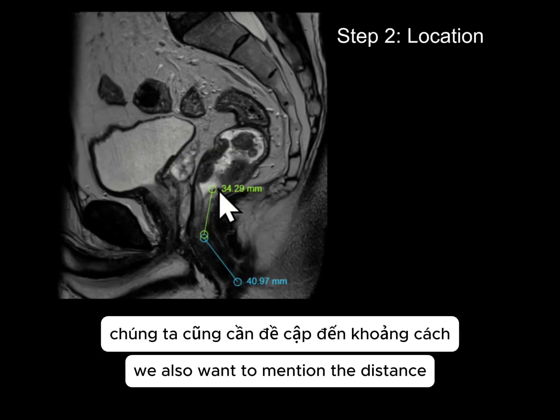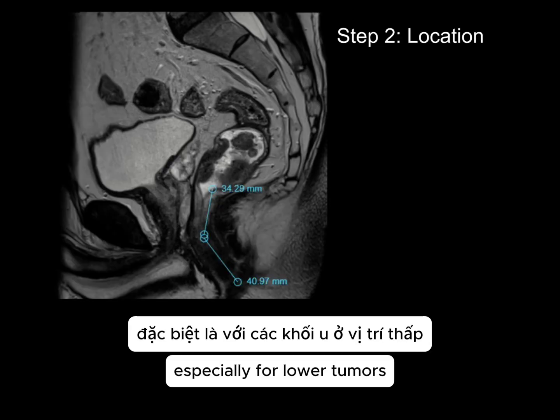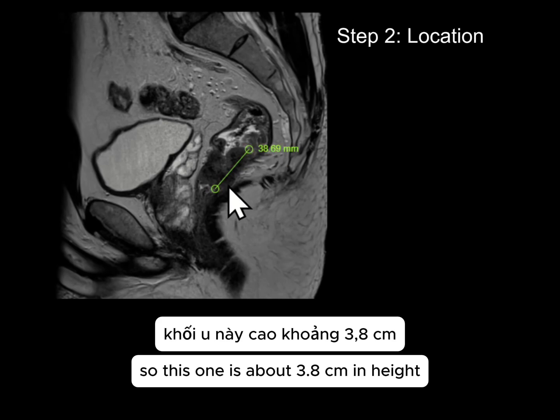We also want to mention the distance from the tumor to the anorectal junction, which has surgical implications, especially for lower tumors, as well as the height of the tumor. So this one is about 3.8 centimeters in height.